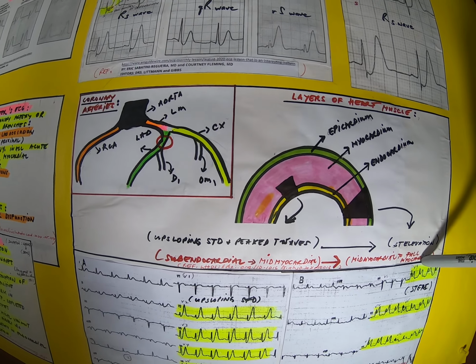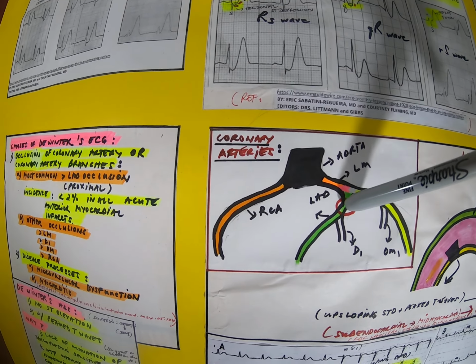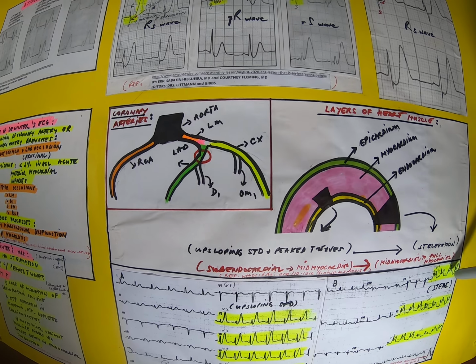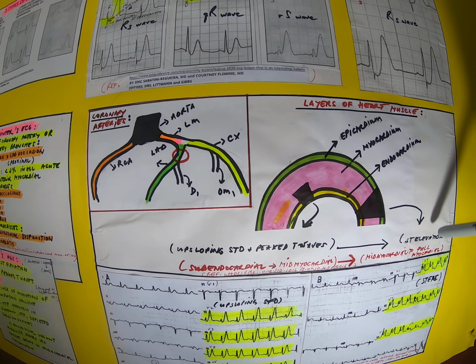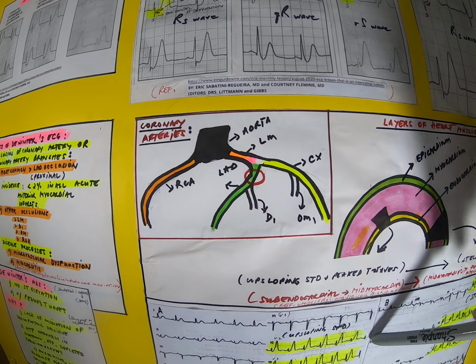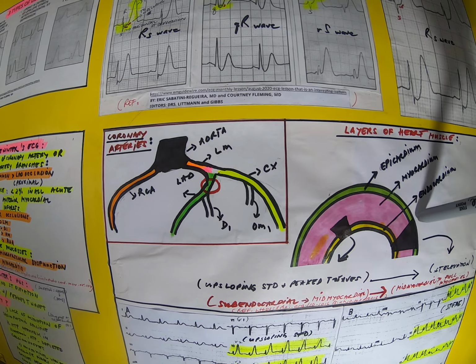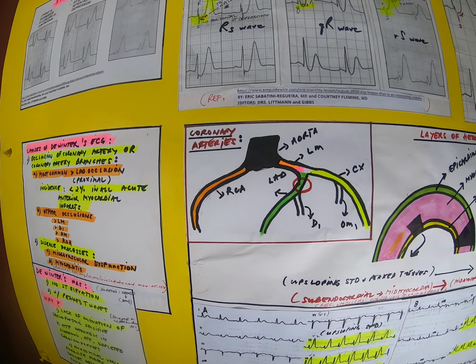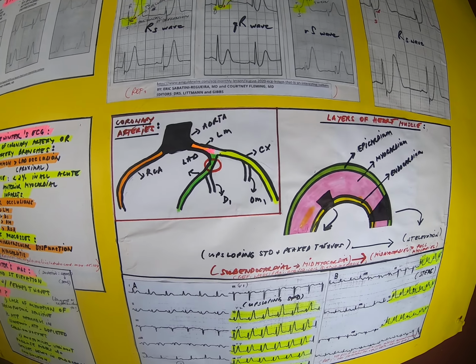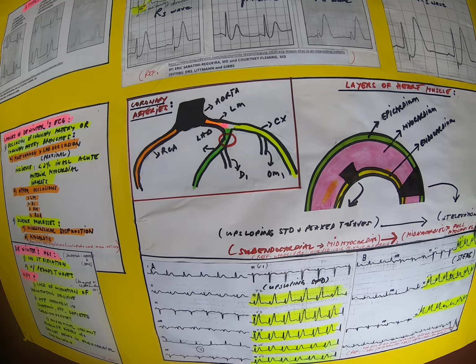So the bottom line is they found that there's a blockage in the proximal left anterior descending artery. So they put a stent, then the problem is solved. Okay, so it's proven that we have a blockage in the LAD, and that has been stented, and the problem is resolved. So that's good. So the duration is short. It starts creeping into the myocardium, to the full myocardium, if not treated right away. So whenever the doctors see de Winter's, they go right away and bring the patient to the cath lab and look into it, and that's what they're going to see, a blocked proximal LAD.